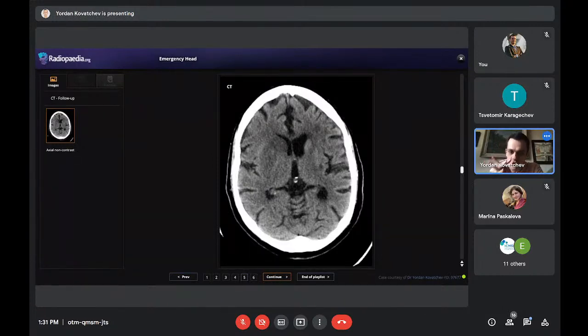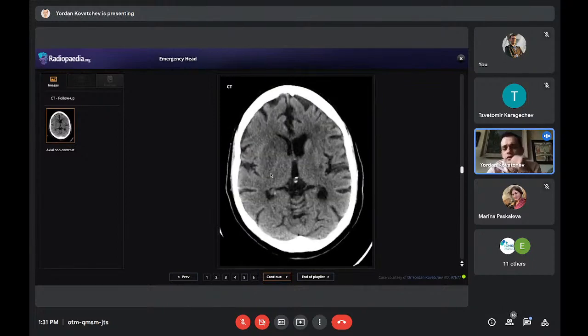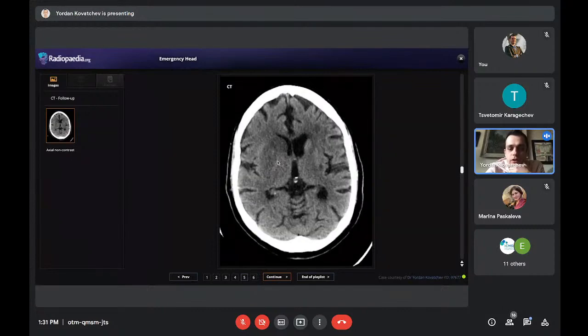It will basically shrink because there is cerebral malacia, so the brain is dead. There is nothing left there, and it will start extending negative mass effect on the frontal horn, and instead of pushing it in like this, it will actually start pulling it. So this is how you know when the infarction develops in time, but still this is pretty acute. It's in the first 24 hours.